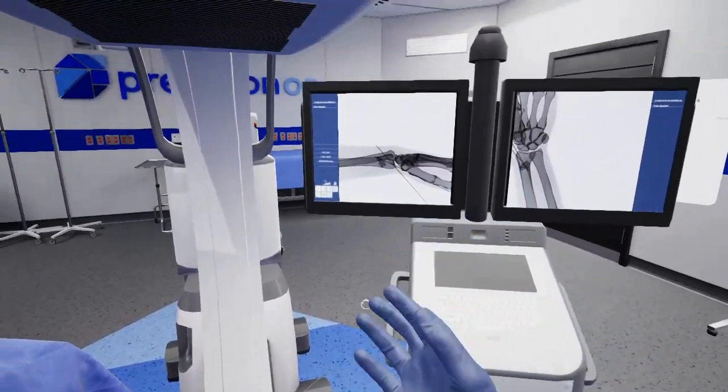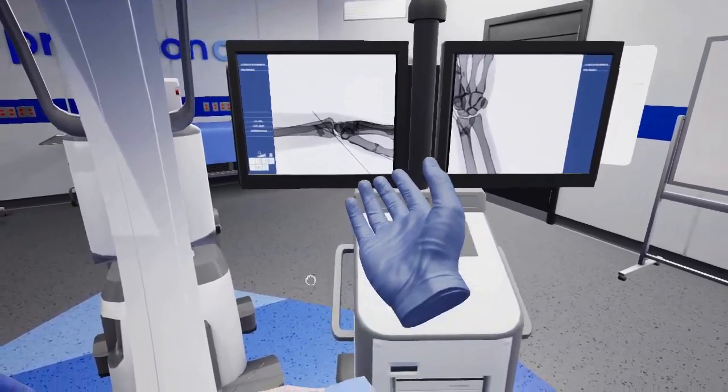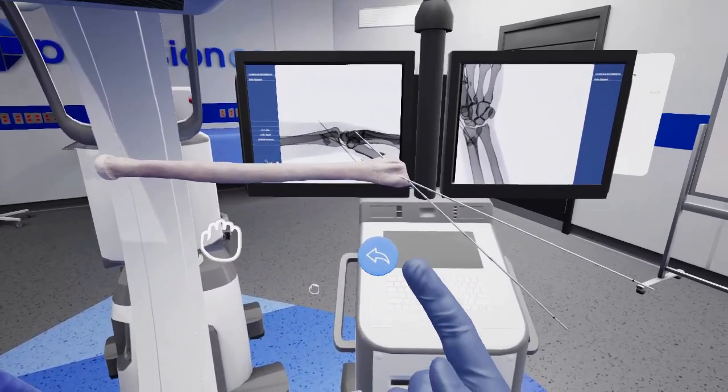This is coupled with our fluoroscopy that shows my K-wires are not in a good position, and I can understand what this is actually showcasing by holding it directly up to the monitor and seeing that exact visualization in 3D.